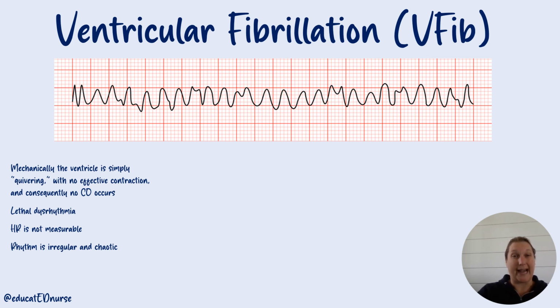So thinking about Vtach, you can tell that Vfib is similar. One thing you'll notice with Vtach is that the amplitude on those QRS complexes was higher, right? And then in Vfib, it's a lot smaller. There are a lot more electrical opportunities, I will say, for the defibrillator to pick up on Vtach than Vfib. The finer it gets, the less electricity is available for that defibrillator to pick up on. So it's super important that you start CPR and you defibrillate them ASAP.